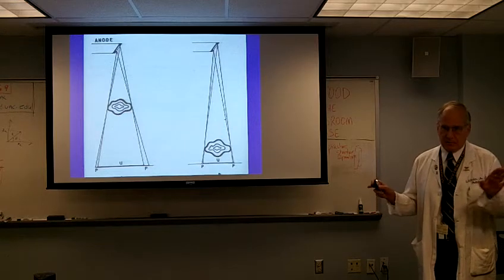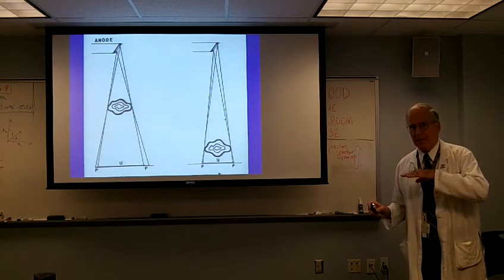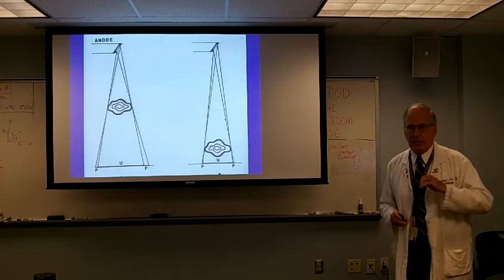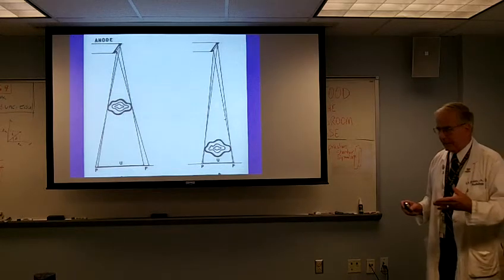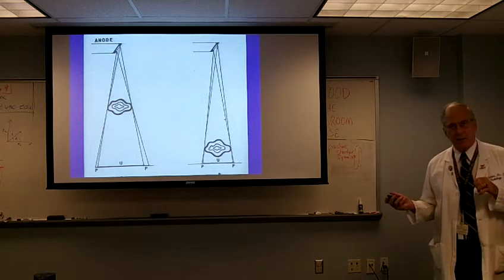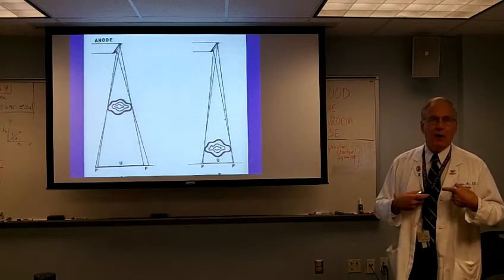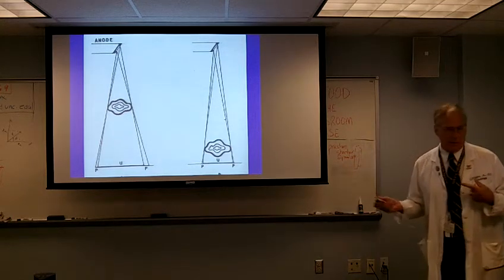Now, I know this is old hat to you. You all understand this, but remember, I'm giving this presentation to house officers and medical students who don't understand the techniques that we use and why this is important. So if you're looking at heart size on an AP chest, the heart is further away from the image receptor, so it's going to look bigger because of this.